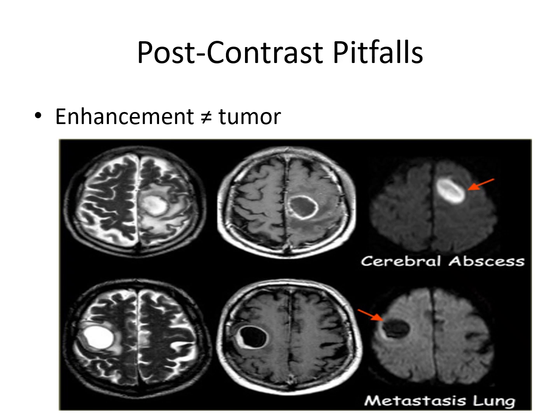We can see here in this image, the first one is the T2 image showing a high signal intensity lesion with a peripheral low signal intensity rim. Both lesions appear similar and there is also surrounding edema. The first image shows more edema as compared to the second one. This is the contrast image, and both show peripheral enhancement.